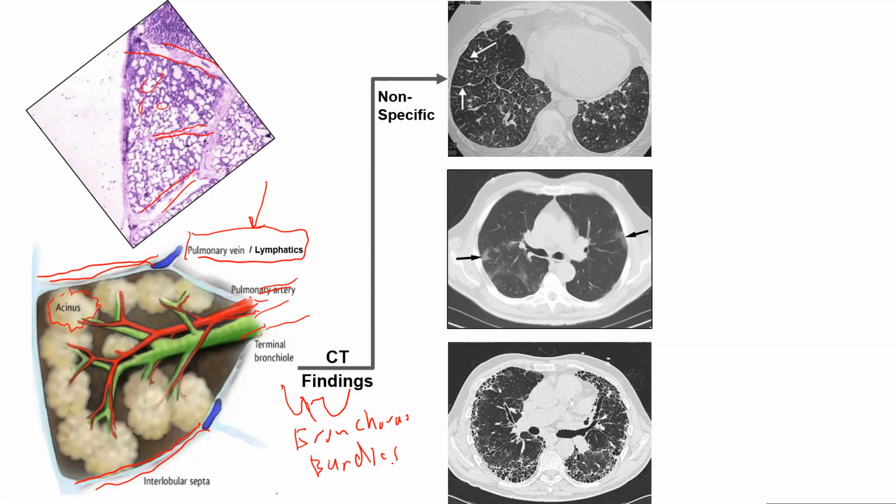So right here, it's kind of cool, this imaging to the right, that you can see this patient's secondary pulmonary lobules right here. They're definitively outlined, and they can be outlined for multiple different physiological reasons. A lot of different disease states can cause thickening of this interlobular septa. So it's pretty non-specific. The first disease state that can cause thickening of it is just basically water, right?